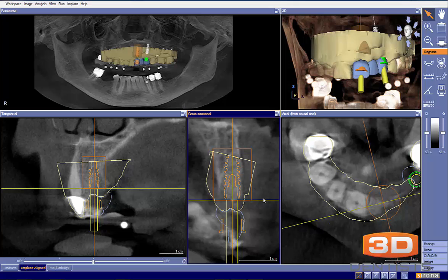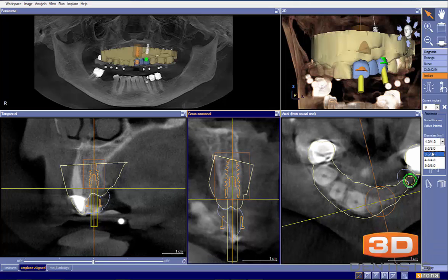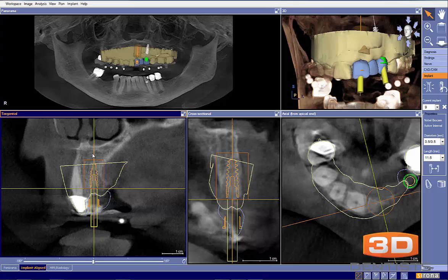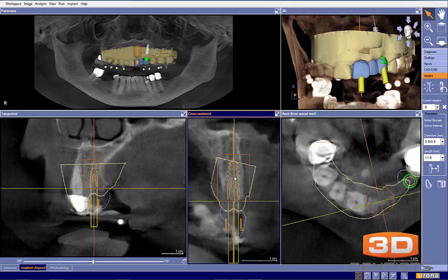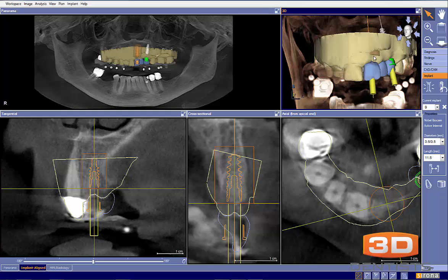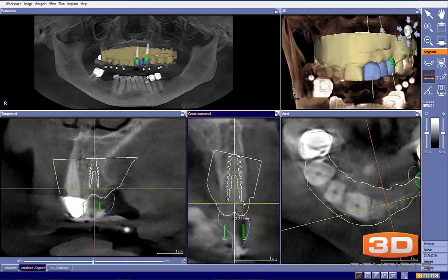And honestly, a 4.3 may be a bit large for this particular site. And now we can start getting it going about like so. Okay, so now we're getting this a little bit better. Now again, assuming that our margins are drawn correctly here based on how you want it, we want our implant to be approximately 3 millimeters below that. So our implant height is about accurate there. So I don't have any major issues with that.